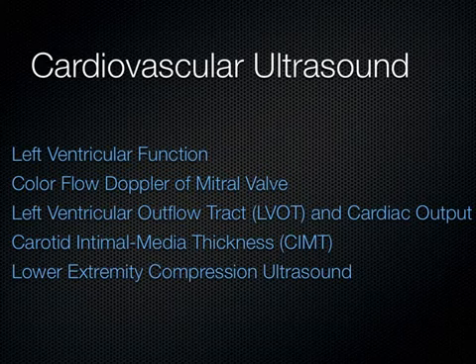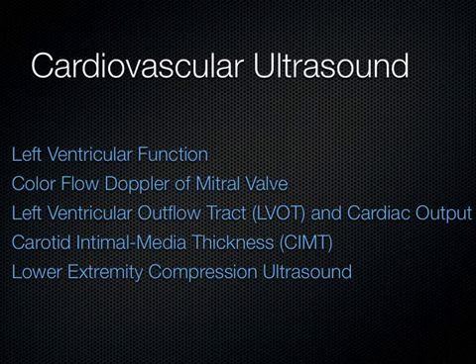Okay. All right. We're going to be talking today about cardiovascular ultrasound, specifically the left ventricular function. I know I went to you guys last year and we described some of this where you could see the contractility, and I was talking about the mitral valve coming up and smacking the septum. Remember that? Does that ring a bell? That's probably the only thing you remember. That's cool. No problem there. But we're going to review that.